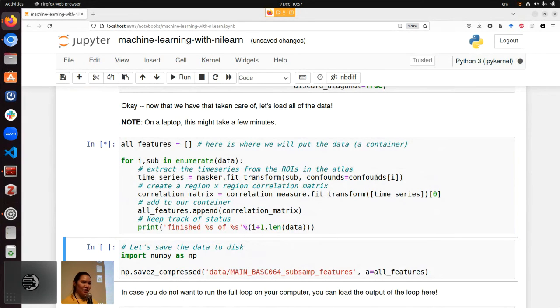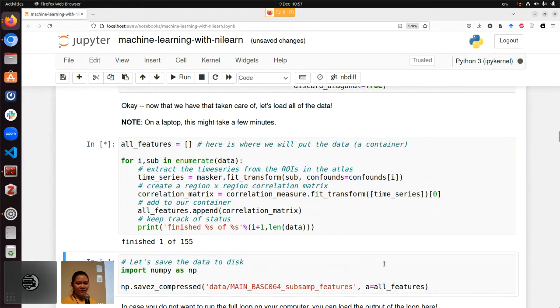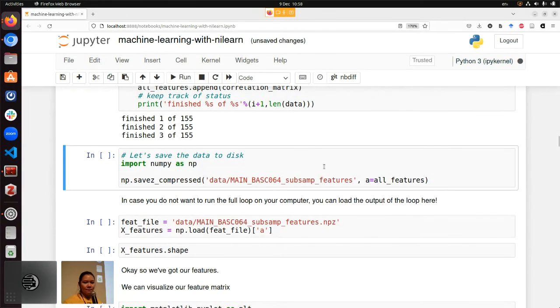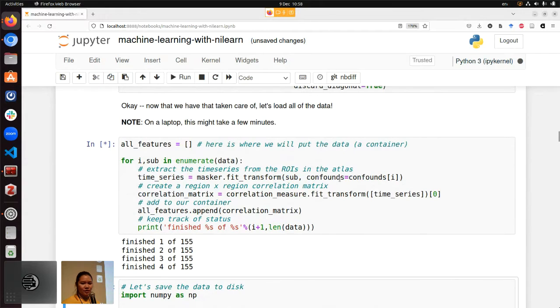If you have run this tutorial before, you might have already saved all those features in a file. A lot of the time when we are working with more data than we have over here, you would run these things in a separate workflow and save that data out in some kind of format. Usually, I personally prefer just a text file, and then you can save it out and load it afterward.